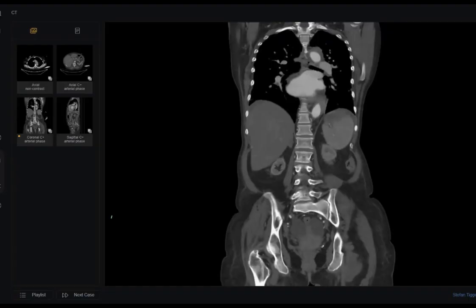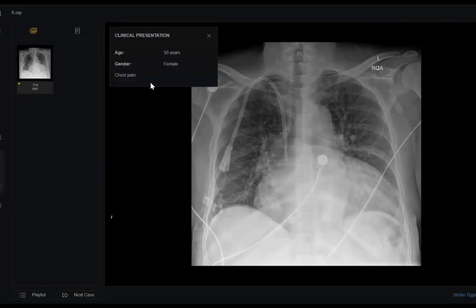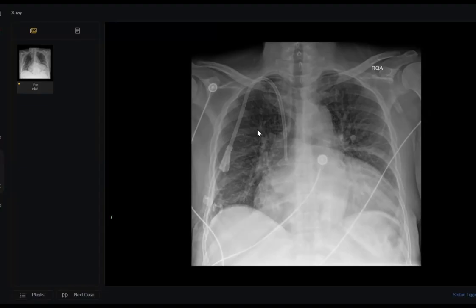I wanted to tell something here in the X-ray. You forgot to talk about this widened aorta. This is very important. Unfolding of the aorta? No, not unfolding. Widened aorta. See the aorta, this is the contour. Suddenly it came here, a convex border, dilated. And the patient has chest pain, and this is not a young patient. Fifty is not young. Okay, my colleague.